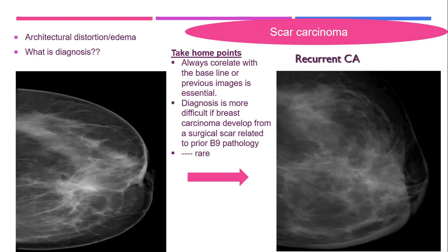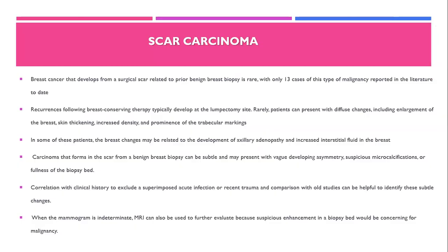We have to look for any fullness, or if the calcification moves aside or becomes more fragmented than previously. If you have dystrophic calcification getting fragmented or moving from its place, or the scar showing some fullness, then you have to consider that you have a mass arising at that area. Okay.